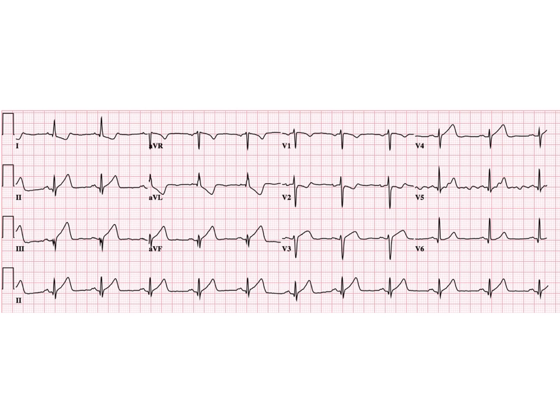So here's our first one. The question is, what are we looking at? What kind of ECG is this? Okay, so pause the video if you want to think about it. But what you're seeing here is an ST segment elevated MI in the inferior leads.